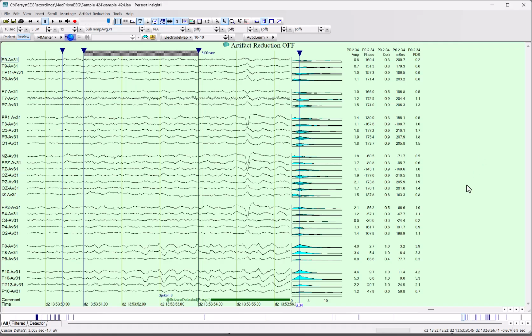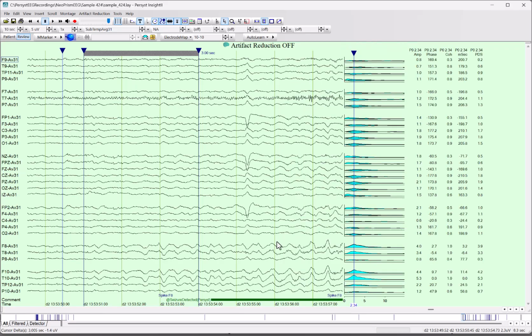Again, this is mainly going through how to navigate the user interface because these are more traditional Windows conventions as far as having the mouse pointer change when you're at a certain point of the screen. With mobile devices having taken over pretty much all areas of influencing user interface development, some of these things may not be as obvious today as they were back then. So this is just something that helps streamline the process of learning this, is how are these screen elements navigated. Okay, let's look at some other things with respect to this.